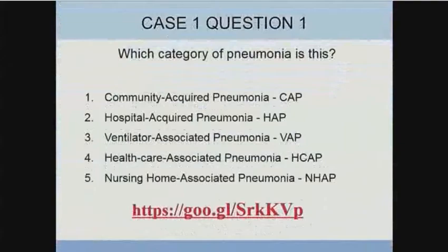So here's the question. Which category of pneumonia is this? Is this community-acquired pneumonia, hospital-acquired pneumonia, ventilator-associated pneumonia, healthcare-associated pneumonia, or nursing home-associated pneumonia? So here we go.